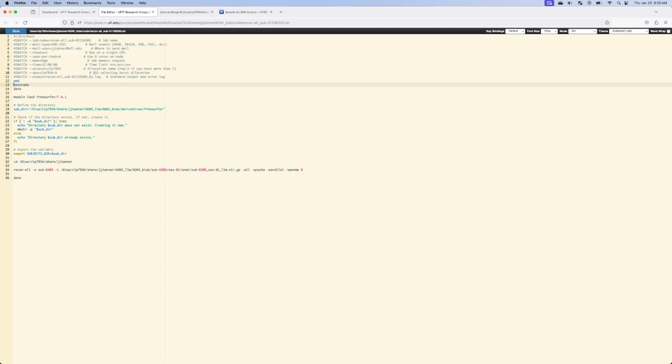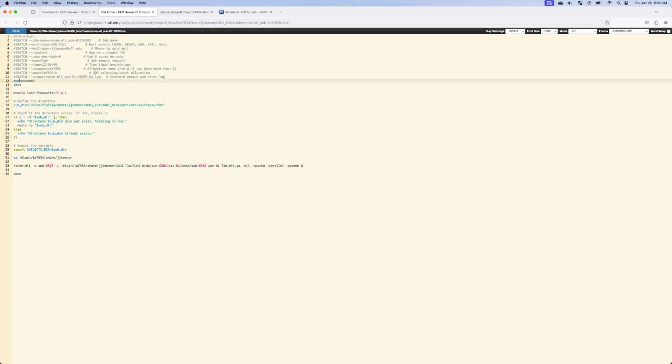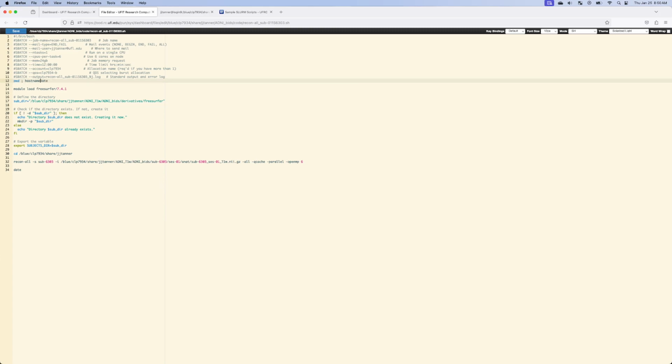And that's probably the best thing to do, but just to make it a little bit more compact, can do that. Now you don't need the space before the semicolon. I kind of like having the space there just to have it there, but you can get rid of the space. Okay, so those are the first 3 commands it's going to run.